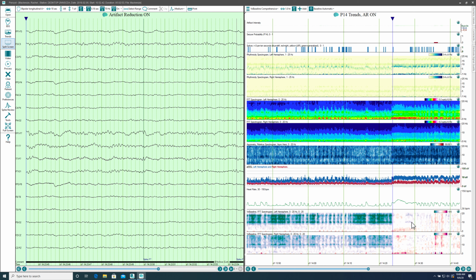In retrospect, we see how the new versus baseline trend can support reliable recognition of important changes in the EEG. They may happen slowly over time and otherwise be more difficult to recognize, and therefore how this important new versus baseline trend could allow for clinical decision-making sooner in some ICU cases.